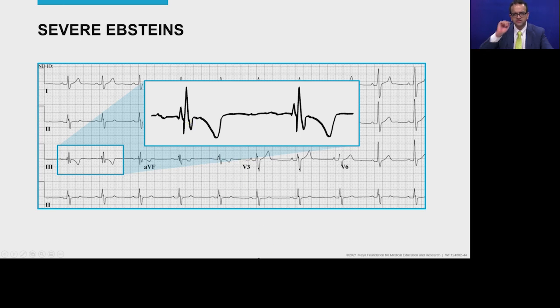Now, this is again seen in patients with Ebstein's or any patients with significant scar in the heart because of just slowing of conduction. Another clue, as you saw, is that the PR interval is slightly longer. So in Ebstein's patients, there is really no problem with the AV node, but because the PR interval is the summation of time from the onset of atrial depolarization to the ventricular depolarization, as the duration of atrial depolarization is very long due to significant slowing of conduction, sometimes you can get this longer PR interval in patients with Ebstein's anomaly.